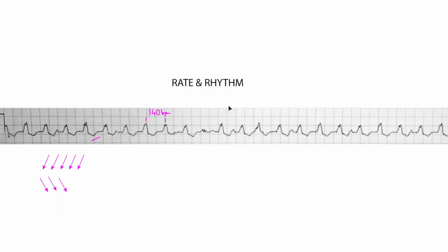Okay. Now I'm going to zoom out a little bit and look at this. We have something going on here. This portion of the signal appears to interrupt what's going on here. So the QRS complexes that are coming in here seem to be pretty regular, with the exception of this and this as well. So this appears to be a little bit early, but it's so wide, it's so ugly that I'm just not sure if this is regular, if this is a single interruption.